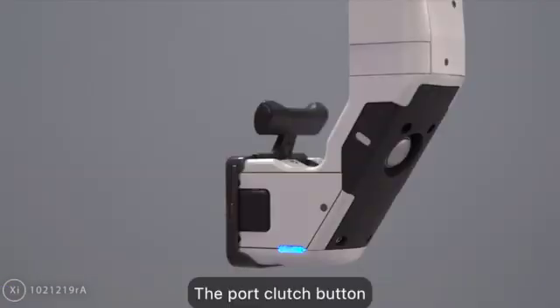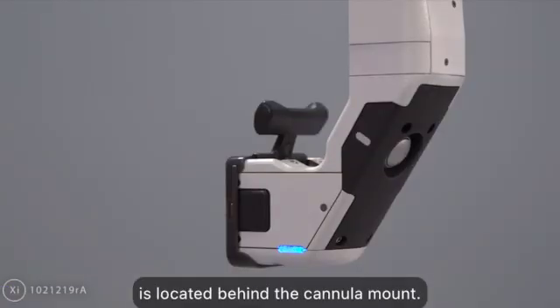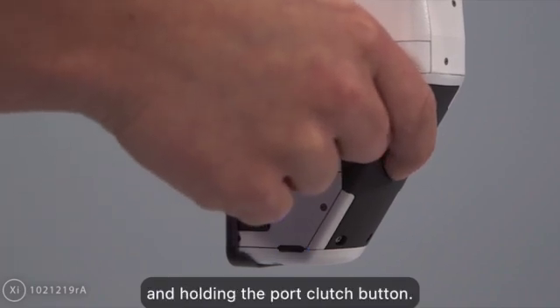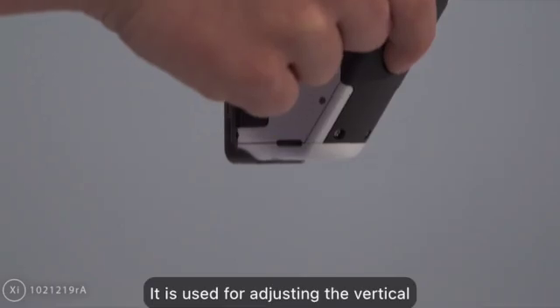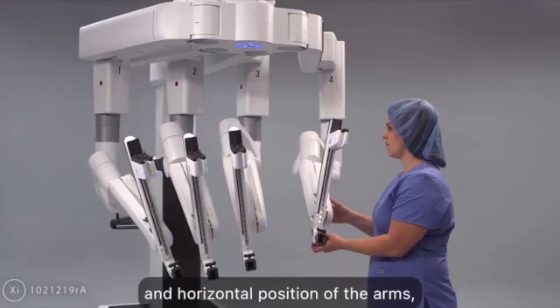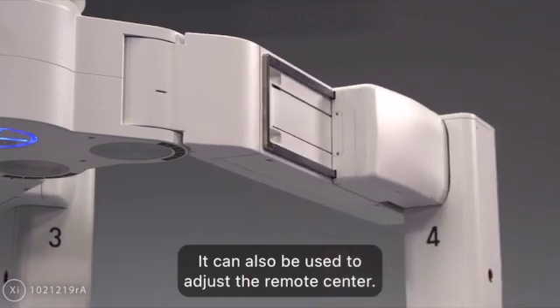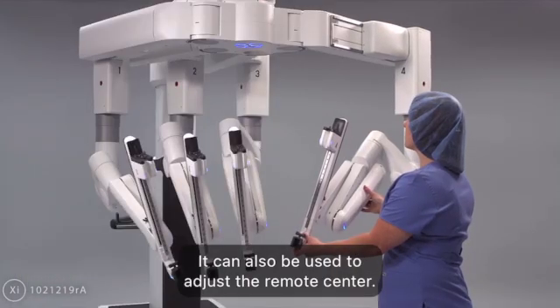The port clutch button is located behind the cannula mount. It is activated by pressing and holding the port clutch button. It is used for adjusting the vertical and horizontal position of the arms, including the flex joints. It can also be used to adjust the remote center.